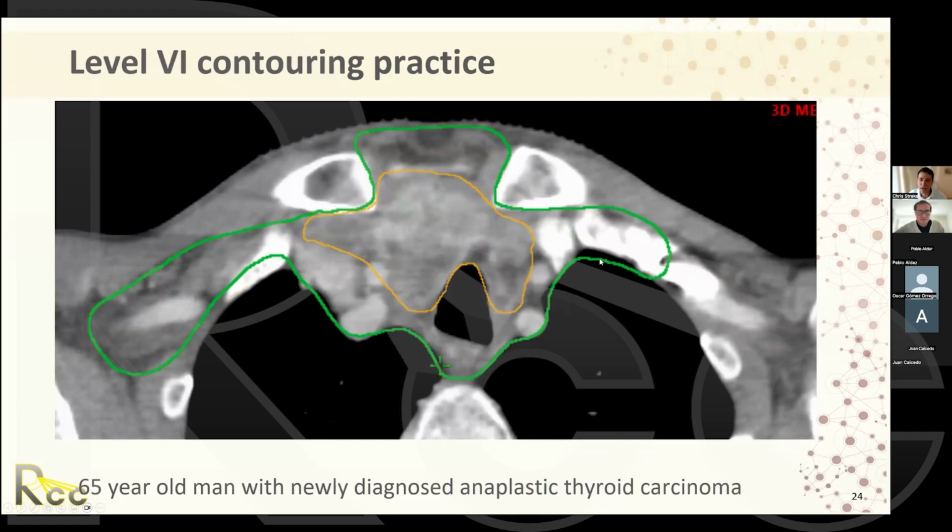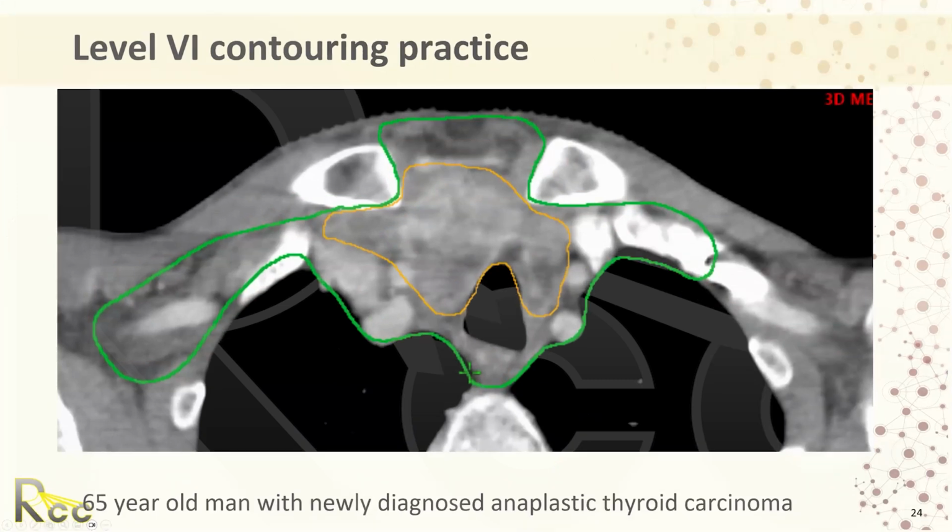It's tricky because I've been emphasizing that we want to try to spare the esophagus, but this would be a situation where we go really big in the contours, because again, these lymph nodes can track back. That level 6B tracks all the way back here, and in the gold standard reference we were looking at earlier, the esophagus had already moved more laterally here, so it's more obvious that there was a nodal station back here.